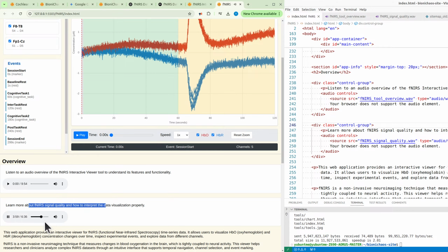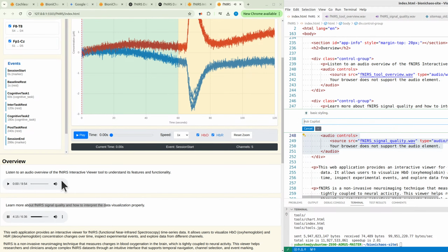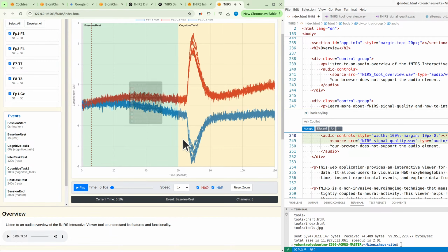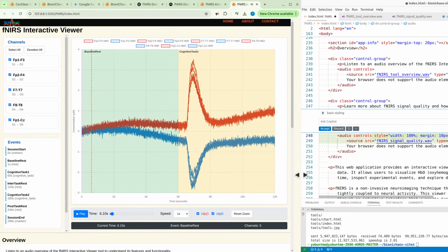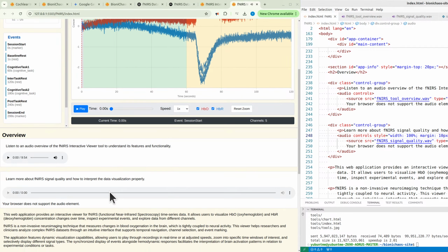Okay, that's where it asks about onset and offset. That's not really typical biologically. It strongly suggests, again, either some very aggressive artificial cleaning or maybe the data was just generated to look that way. Wow, okay. No lag, that's a big one. And the third point from the critique. This one's about the consistency between different channels and the specific values you see when you, say, hover over a point. The tool shows concentration changes in micromolar units. Right. The source noted that. Why is it now like disabled?